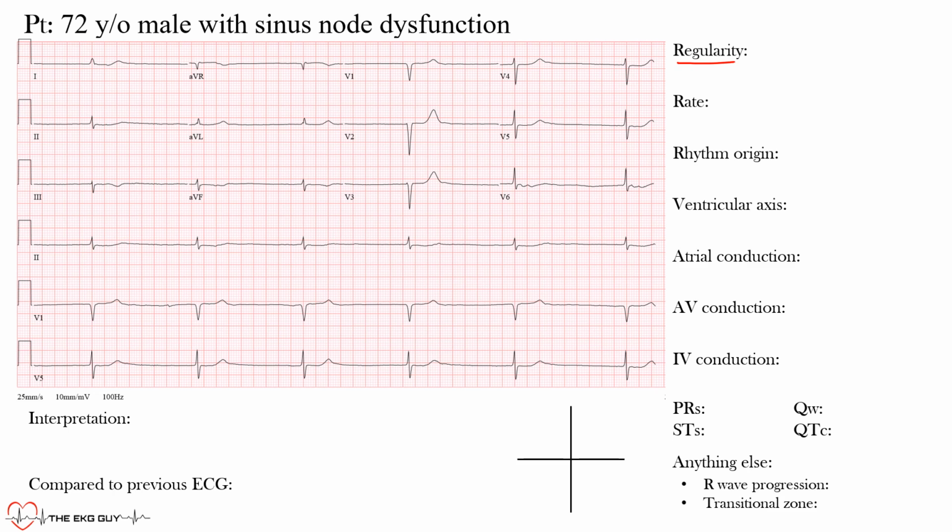So here, we want to use these rhythm strips down here. This is a standard 12-lead EKG, and these bottom leads here are 3 rhythm strips. What we want to look for are intervals being consistent throughout. We typically look for these R waves here, these positive deflections. You can see that there's about 6 there. From one R wave to the next, we call that an R to R interval. And as you can see, here's the next R to R interval, and then one that follows, and so forth.